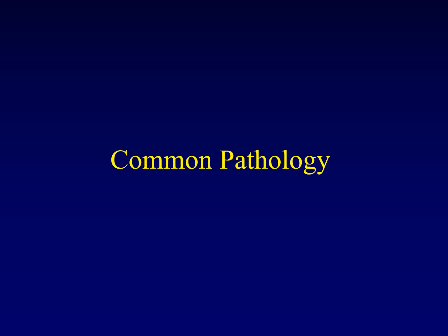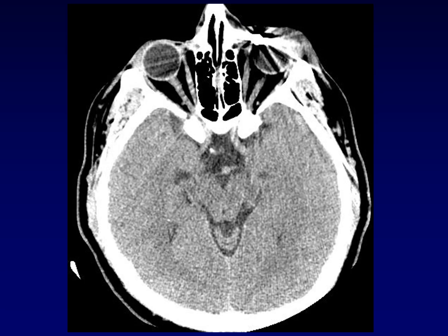In this next part of the lecture, we're going to talk about some of the most common pathology that we encounter in neuroradiology. This is a CT of the head, and it's a little hard to make out some of the features. Something's gone wrong right here, and there are all these lines starring out from a point right here near the eye. This is what happens when something in the body is so radiodense, absorbs so many of the X-rays that essentially none get through. This really messes up the mathematics that we use to create a CT image, and that's why you get this starring artifact.